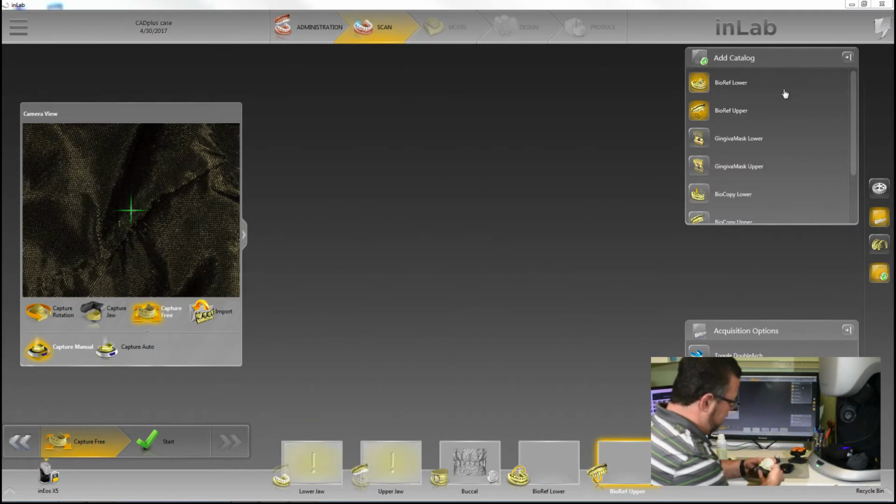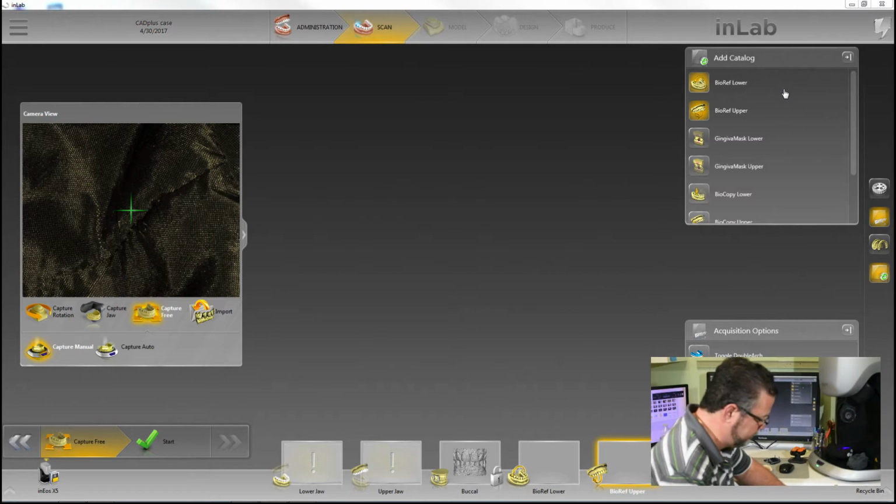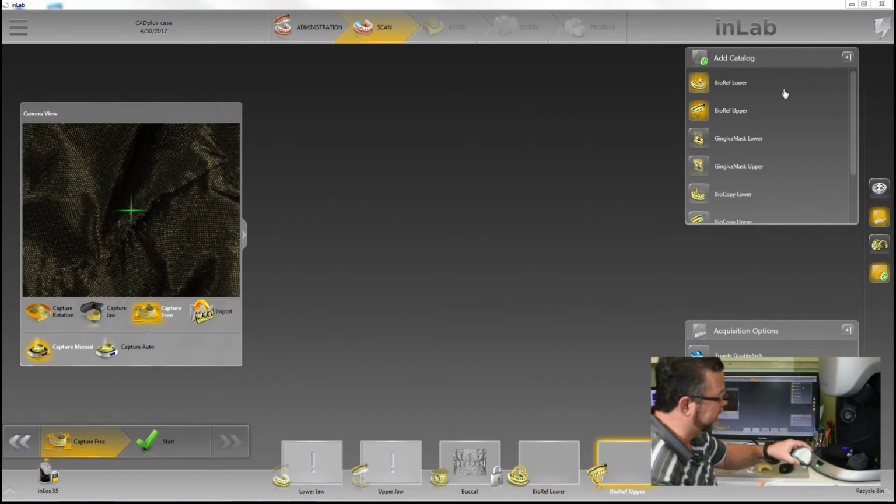Very simply, I'm going to take my putty, press the denture into it lightly, and now I have to powder that. See, again, a very light coat. I can look for anything shiny and lightly dust it.